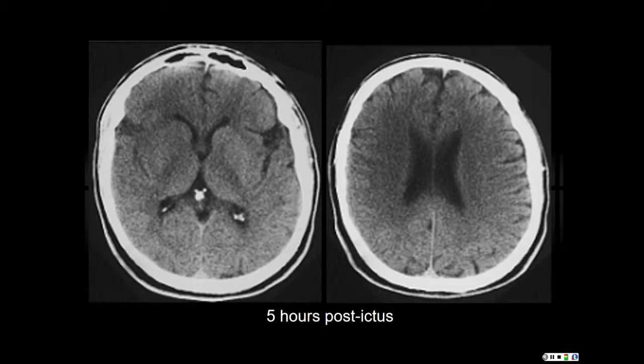All right. You feeling fairly confident? Okay. Knowing what we just discussed in terms of where the branches of the lenticulostriates come off, where is the thrombus? Is it proximal to the takeoff of the MCA or distal? How distal? Very distal.